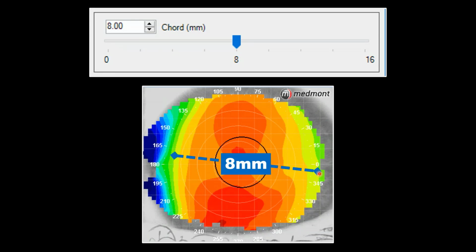Now, why that? And really, you can set it at any diameter that you want, but a 9.5 diameter corneal GP generally has approximately an 8 millimeter optic zone. So that's its point of greatest bearing. That might be a likely starting point to measure your sagittal depth.